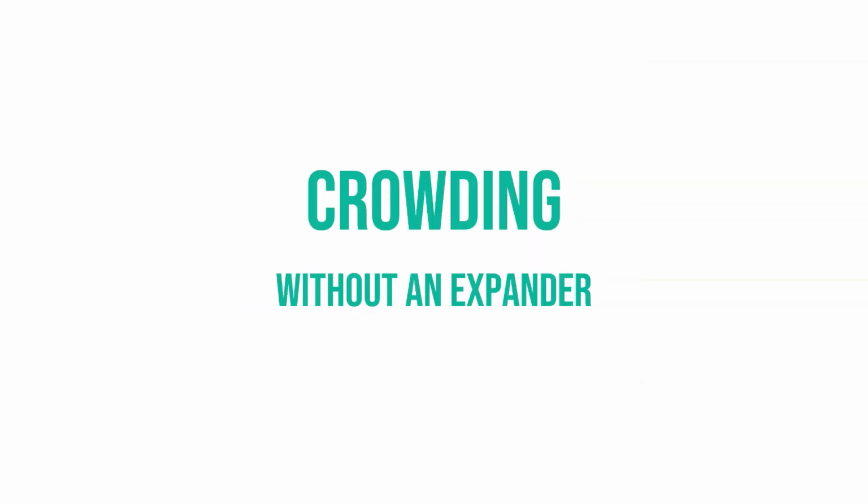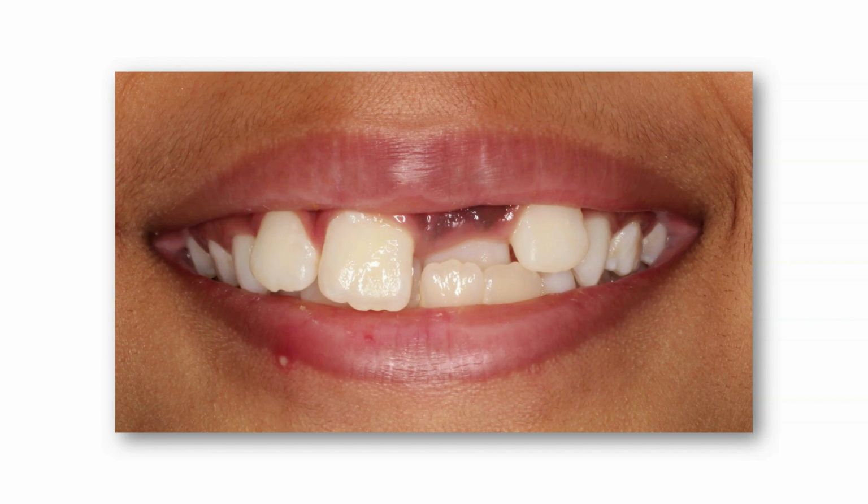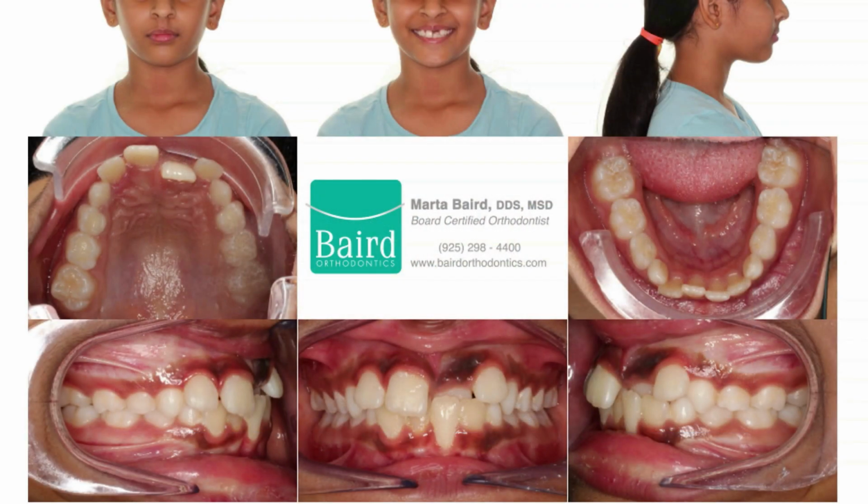Not all patients need a maxillary skeletal expander. Sometimes crowding can be treated without an expander. This patient had crowding of her upper incisors and an anterior crossbite. This anterior crossbite was causing her to have recession on her lower anterior teeth. This traumatic bite can cause that lower recession to increase while the adult teeth erupt.